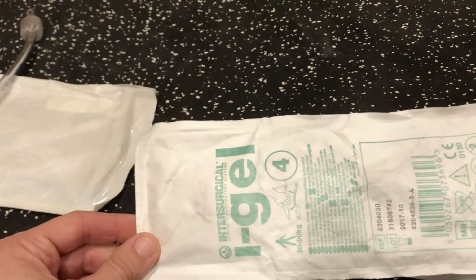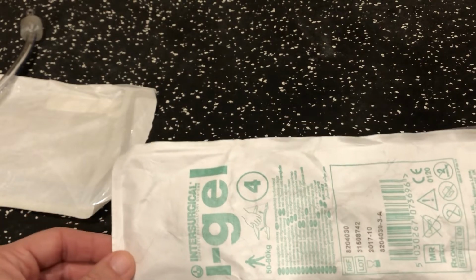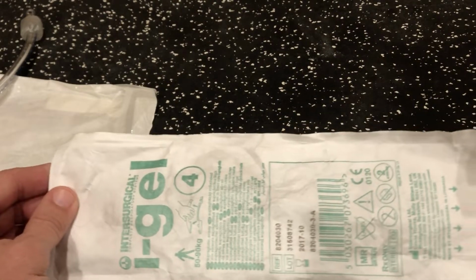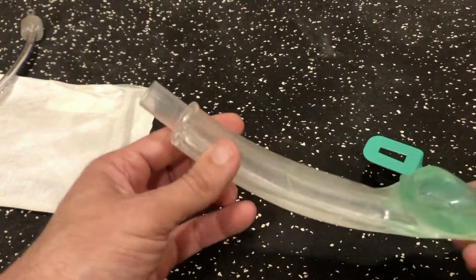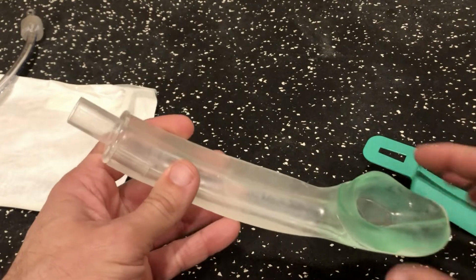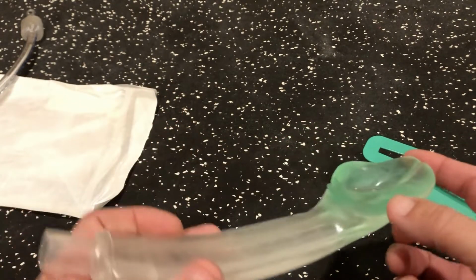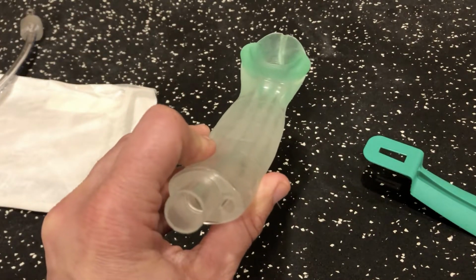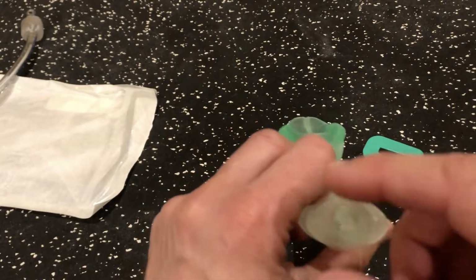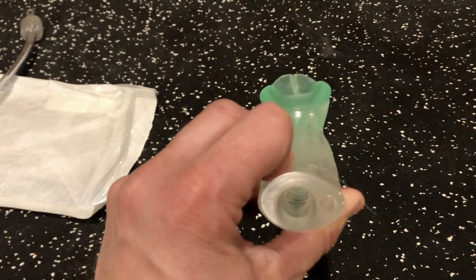The airway system that I really like in the event of an emergency to secure a quick airway is what is called the iGel. It is similar to the laryngeal mask airway you just saw. Most common size is going to be a size 4. The reason why I like this particular airway, there is no cuff that we need to inflate. It is a much more sturdy type of airway. All you need is a little lubricant here, and this gelled entry surface is easy to get into the patient's mouth and then secure with oxygen and start ventilating for somebody.